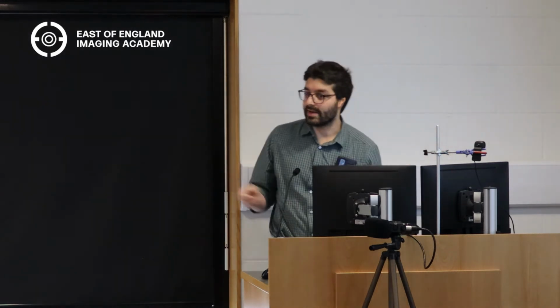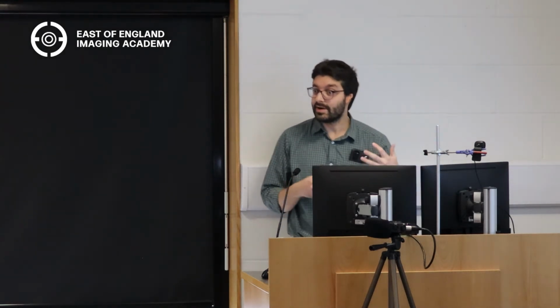So again, as a radiologist, these are the things that we do. This patient obviously has a CT for ongoing pancreatitis, but you're not just looking at the pancreas. You're looking at other things. What else is going on? And this is what makes radiology quite fun, because you are putting together a lot of disparate findings into a single diagnosis, or you're looking for other things that non-radiologists won't necessarily be able to spot. So let's have a look at something else.